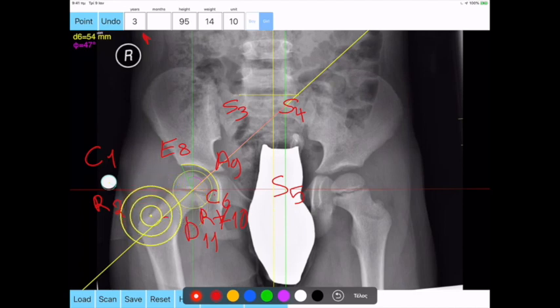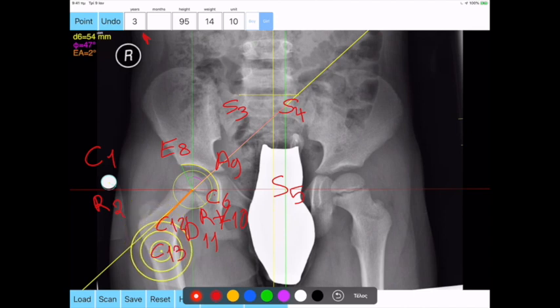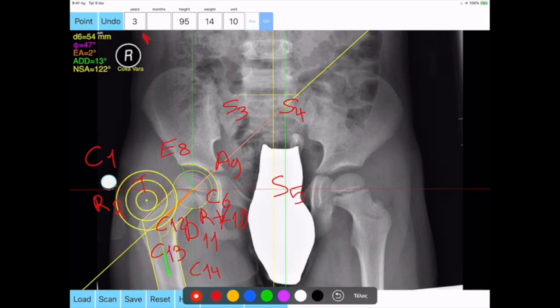The selected 2 points are joined automatically, and the resulting straight line, P6C12, forms the femoral neck axis, orange line segment. By repeating the same task you identify the third point C13 in the femur canal and further distant you choose the fourth point, C14, in the femur canal. The second line segment is drawn C13-C14, green line segment, and is the axis of femur bone. The angle between lines is calculated and the femoral neck shaft angle or NSA angle appears in degrees in the screen.